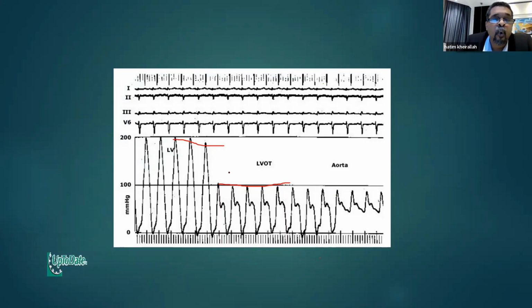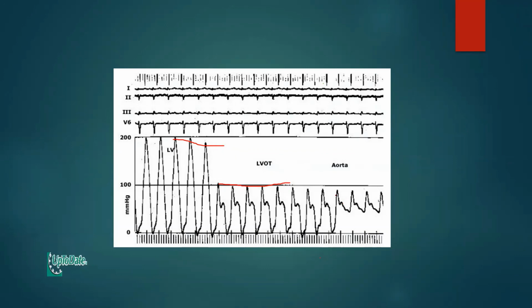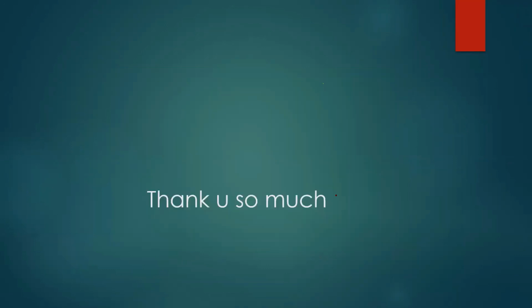So this is HOCM. The other sign of HOCM is the spike and dome pulse morphology. Okay? Thank you so much.